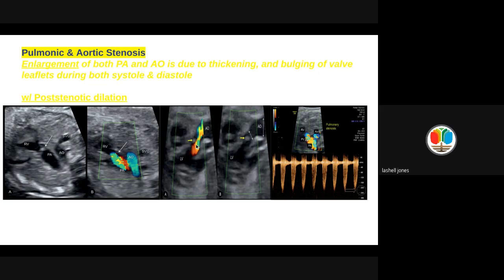So there's a thickened leaflet. And so blood flow is still going through, but there's just some narrowing. So it's still just a narrow vessel, but then you'll see all the turbulence after the obstruction. And that's what's been demonstrated. Okay, so this is different from the atresia. Atresia just has retrograde flow, no forward flow seen in atresia.